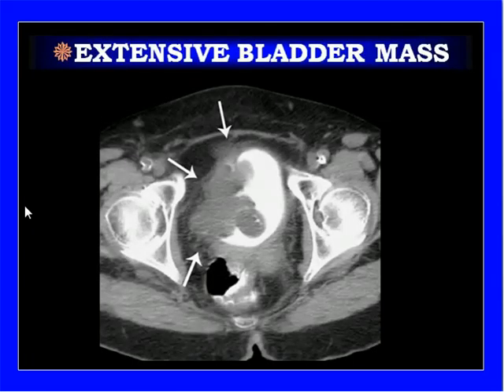Extensive bladder mass, as you can see, it's involving the urinary bladder on the right side with urinary bladder wall, muscular wall, and extravesical structures, fat stranding, and other pelvic muscles and tissues depicted by the straight arrows. CT picture at hip joint level.